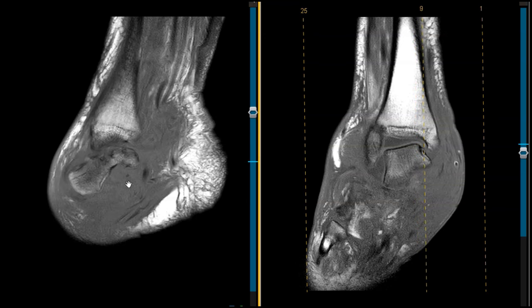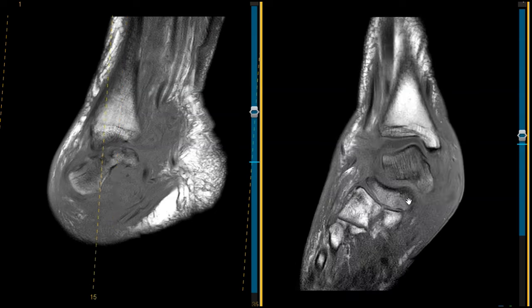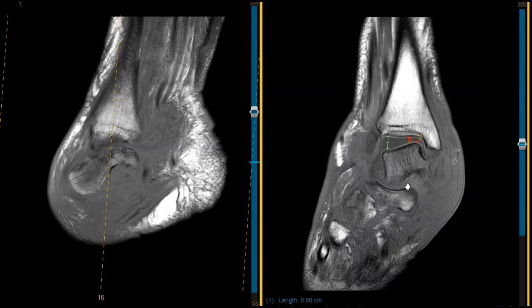Now, one other thing, which is osteomyelitis, could cause this. If the patient has bone infection, it can cause bone fragmentation, destruction, but usually the patient would have some more striking clinical symptoms, we think. This is all soft tissue swelling here medially.